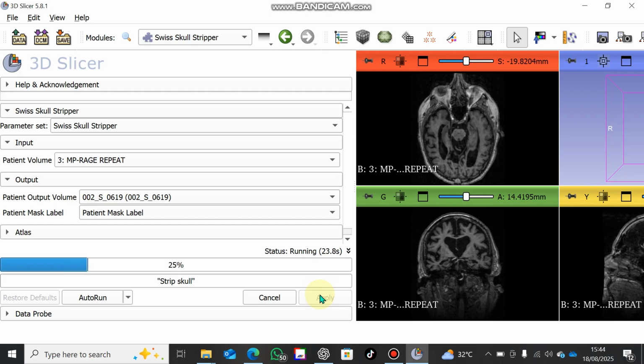Although it takes a bit of time, one has to be really patient. If you have a large amount of data, it depends on the time you spend to extract the brain regions. It's really crazy. I have to sit the whole day to extract the brain tissue one after the other. It's challenging, but it's a really cool approach and not that stressful. Extracting one patient after the other is the only disadvantageous part there, I can say. But it's fine.